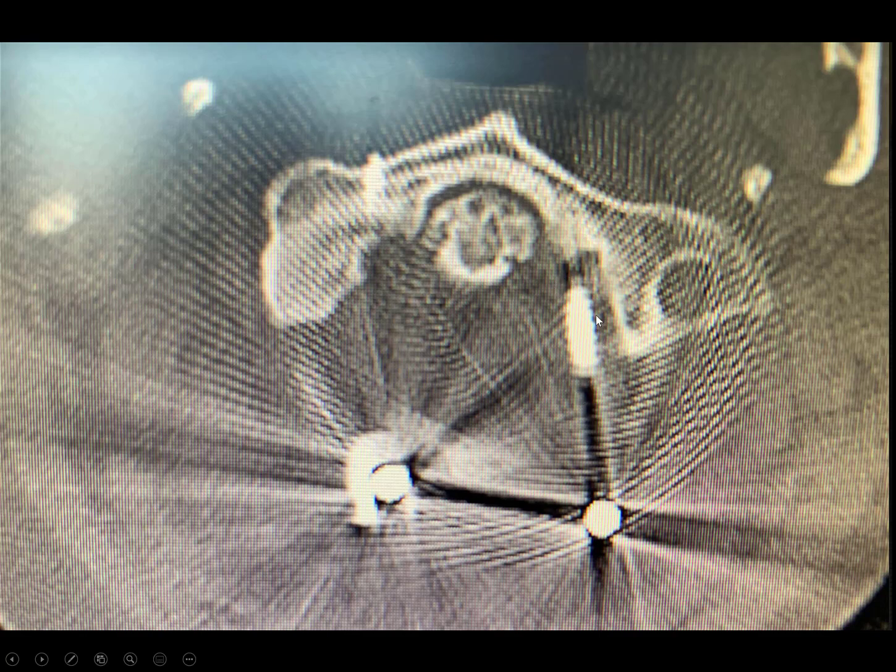So the problem with C1 is that it's a very small bone. And I mean, sure, you can put the screw in, but it can't hold the screw because the bone's too small, especially in osteoporotic patients, you know? While the occipital plate is really strong. I mean, I've never seen an occipital plate tear out. But this is interesting too. That loosened the way you thought, you know, with osteoporotic bone around it.